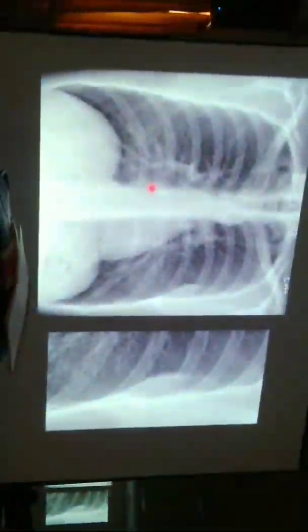Cherubism, excellent. Coming to the ribs, only a few lesions are typically seen on the ribs. You have a short list of differentials. You have METs, fibrous dysplasia, and chondroma. These are common things. Obviously, you have a lot of differentials, but these are the common ones.